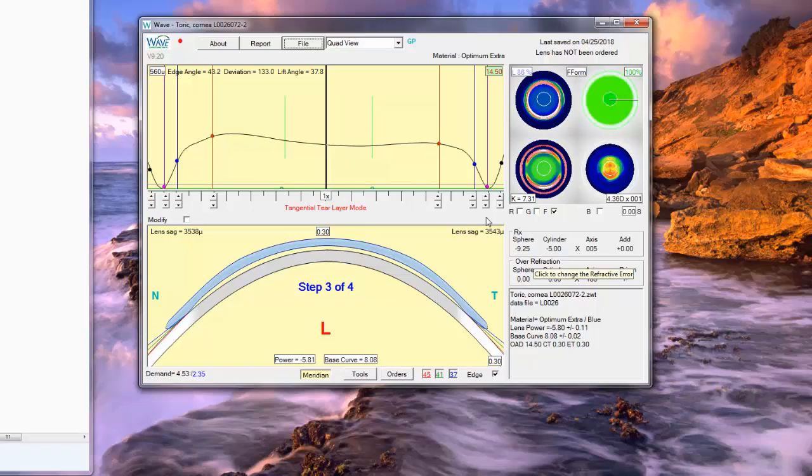And I've made some improvements so that if a design is brought into version 9.2, then the alignment area out here at the very edge of the lens is treated in a new way so that it doesn't get quite so curved. It's easier to control the angle and alignment when the periphery of the lens doesn't get so curved.